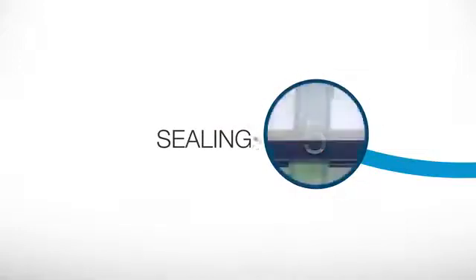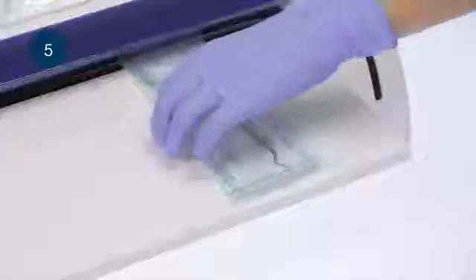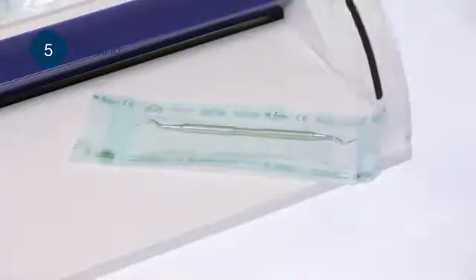Sealing generates a sterile barrier. This is key to preserving sterility until the next time the instrument is used. Instruments can be sealed inside pouches or placed inside a wrapped sterilization container.